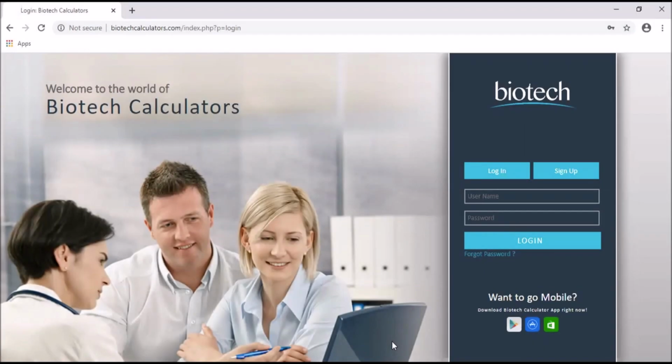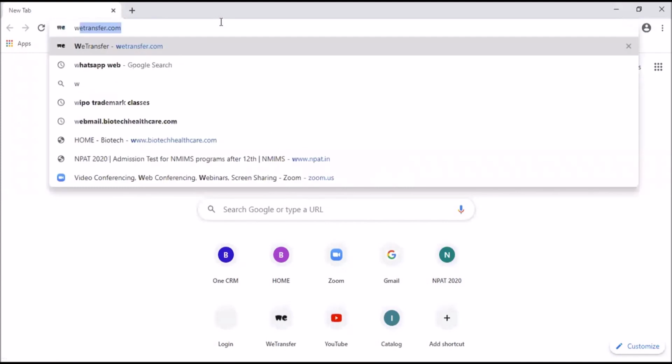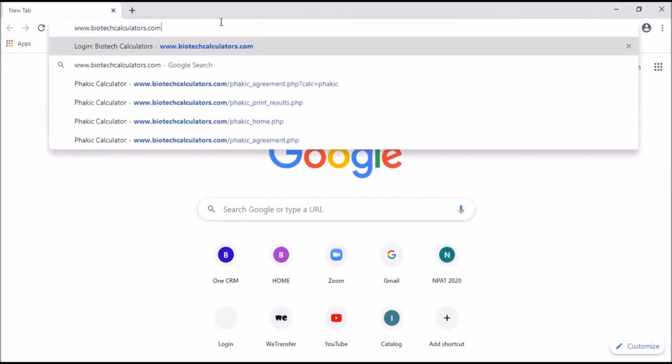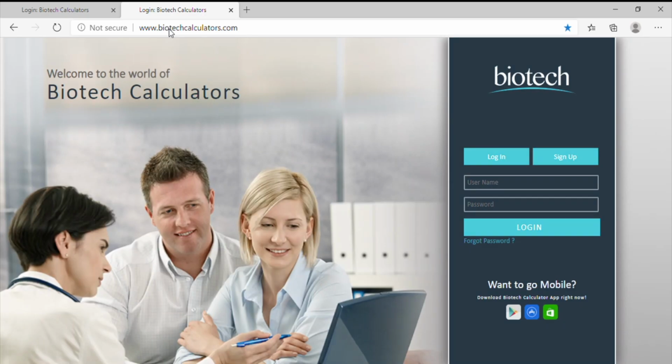Welcome to the virtual tour of the calculator for Eyecryl Phakic range of IOLs. Type www.biotechcalculators.com in a web browser. You will be redirected to the Biotech Calculators login page.